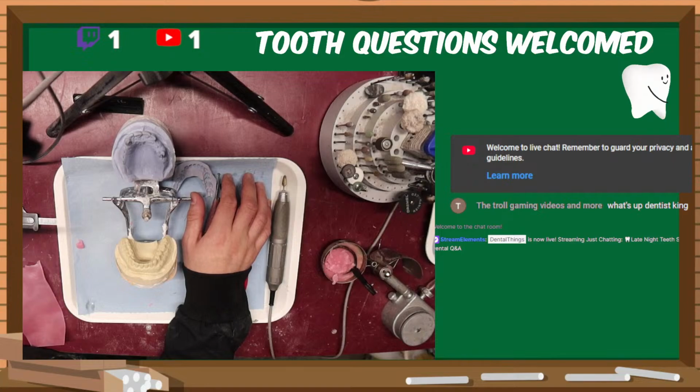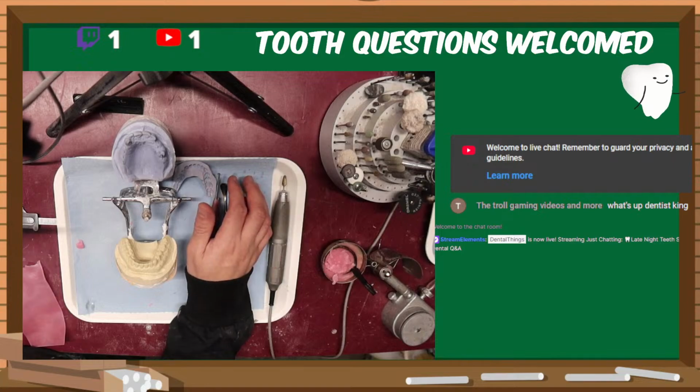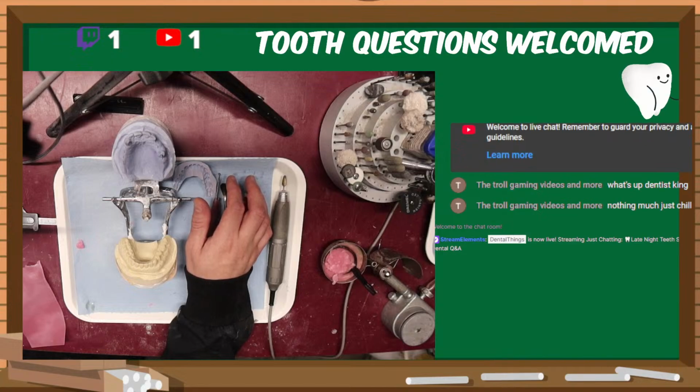Yeah, there we go. Oh, cool. Oh, so that's simpler. And I think I can go and kill this. And I can go for myself right about here.